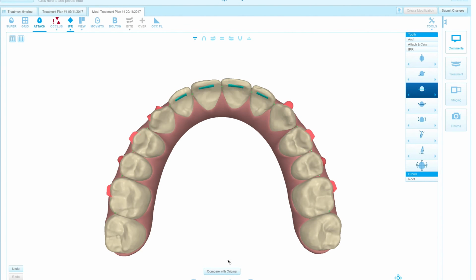And if I use it, I know that I'm going to reduce the risk of inclination of the crown when we expand a lot. Okay, so think about this attachment that we have in this first upper molar just for anchorage, and if you have a good size of the crown, you don't need to use it. But if you feel more secure using that, it's good, and it's a good option because it will increase the fitting of the aligner with the crown.